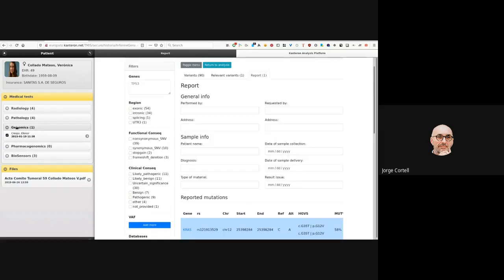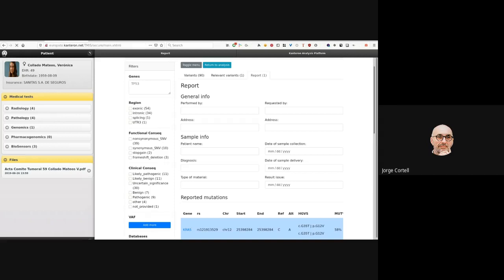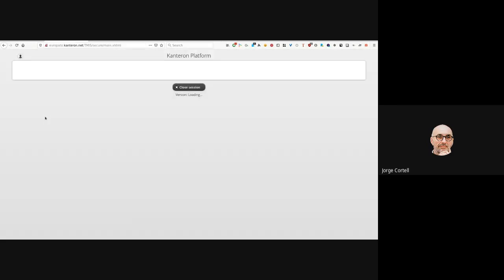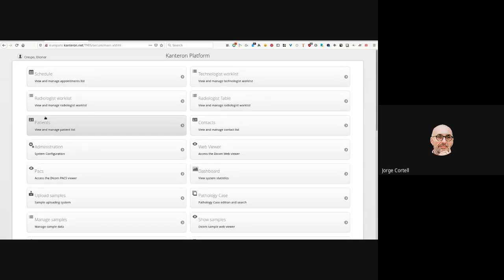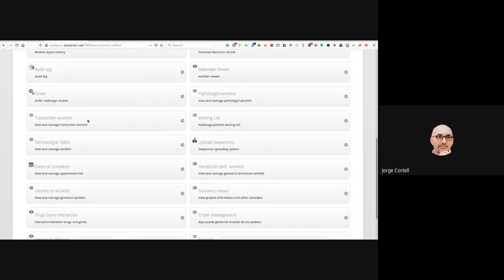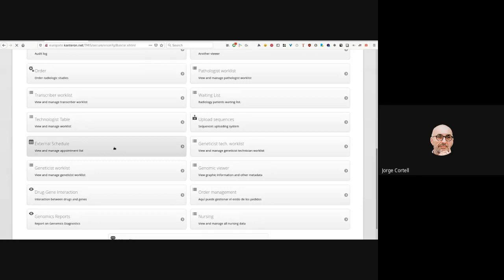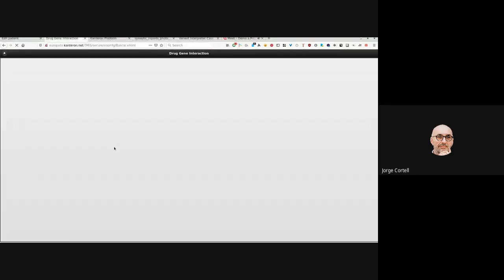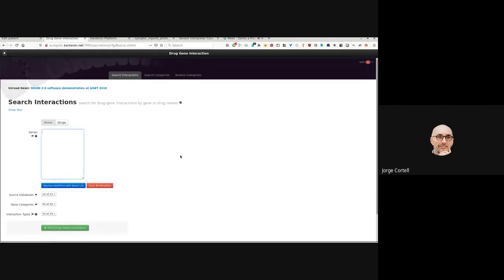And then you have pharmacogenomics. Once all that process, all that journey has been analyzed, has been done, then the last step is finding out what medication may or may not work better for my patient, for this patient with specific variants.